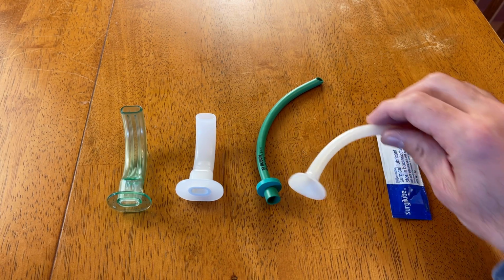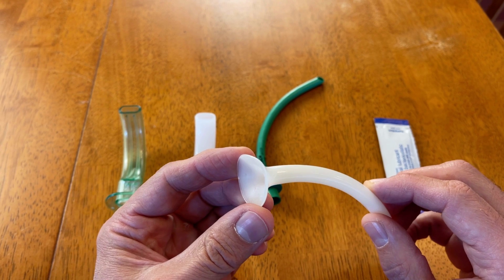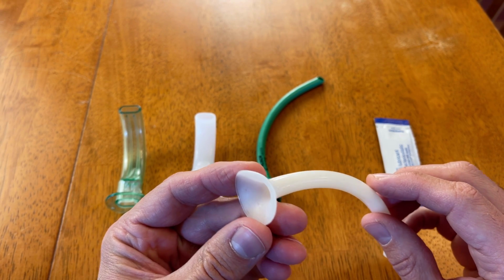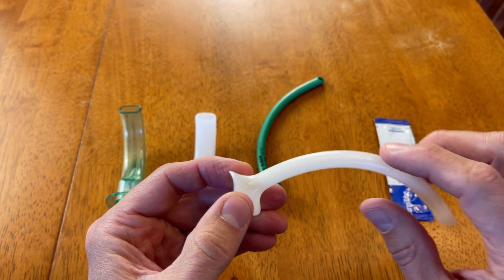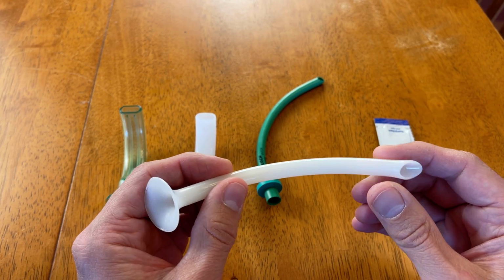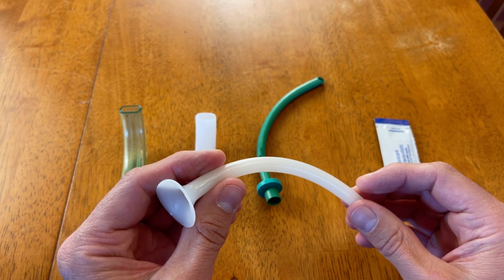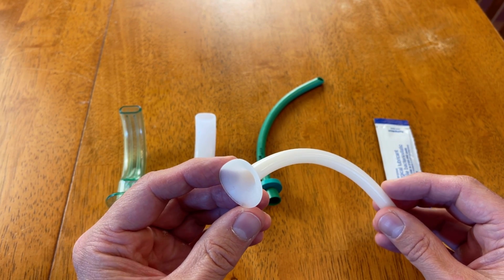The first is going to be the flange, which is the most proximal end here, and it's really just designed to rest against the nares and prevent, I should say, migration of the cannula into the airway. Then there's the cannula itself, the body of it, and then finally there's this beveled tip section here to facilitate passage of it.